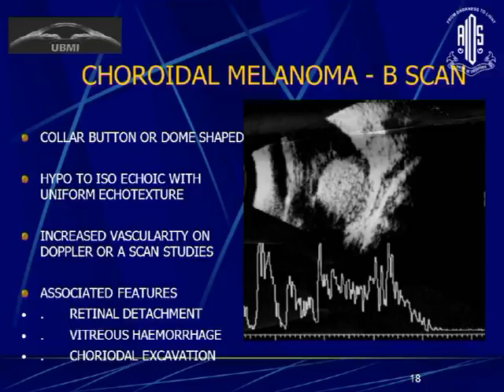Coming to tumors in the elder age group, melanoma is probably the only tumor which can be diagnosed with certainty on ultrasound because it has a very peculiar picture. If you cut a melanoma on a histopathology slide, all the melanin cells are uniformly distributed. And therefore, it is the only tumor which is uniform, echogenic, and of a low intensity all throughout. Now, that is the hallmark of a melanoma.